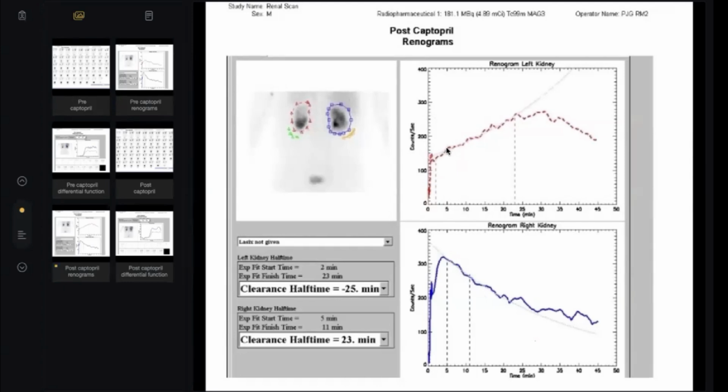The same. Look here. Poor uptake, but gradual uptake. What happened? At about 23 minutes, the kidney is still taking up. Incredible. Very lazy kidney. Look here, at about 23 minutes, the kidney uptake reaches 250 counts. It takes more than 20 minutes. Incredible. And no excretion because it retained the counts, the tracer. Why? It is a lazy, poor kidney.